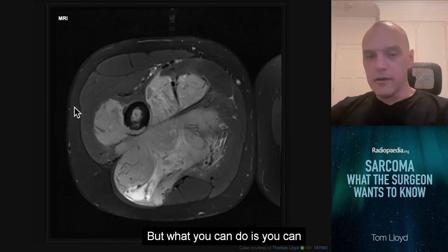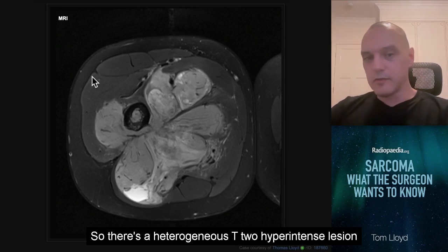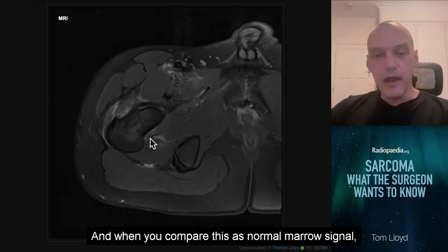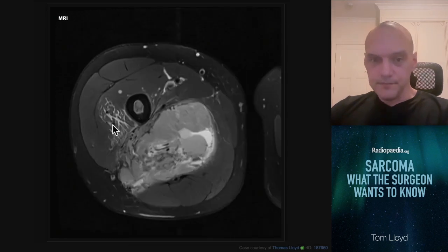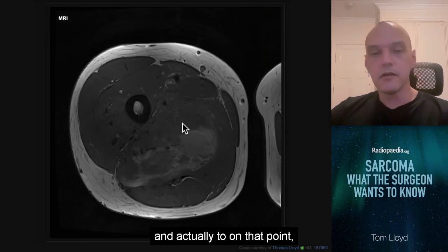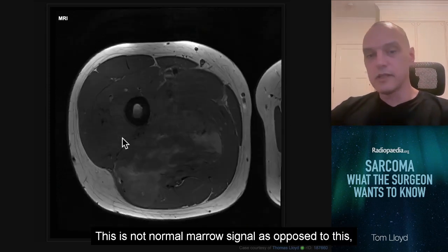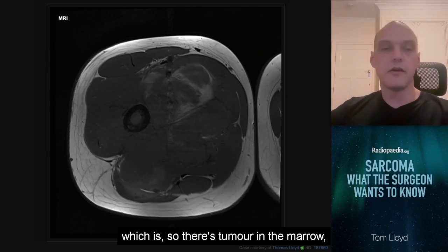But what you can do is be specific with the anatomy. So there's a heterogeneous T2 hyperintense lesion that is within the bone. You can see there's definitely tumour within the cortex of the bone here. And when you compare this to normal marrow signal, there's tumour in the marrow as well. On that point, here's a T1 weighted scan to illustrate what I was talking about earlier. This is not normal marrow signal, as opposed to this, which is. So there's tumour in the marrow.